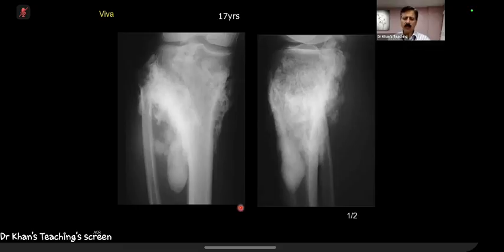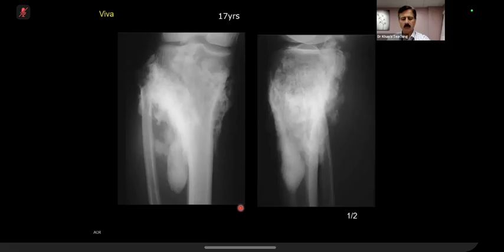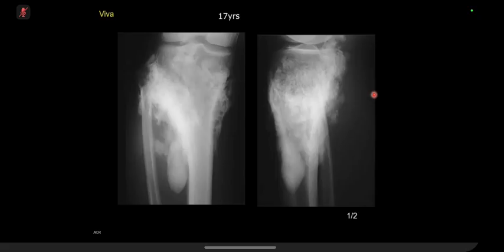Okay, so you described it. Some debate came to your mind as far as chondroid matrix versus osseous matrix. Can you revisit that? What were you considering? Well, just in parts of the lesion. So, for example, on the frontal radiograph, the inferomedial aspect, the calcification appears somewhat septated or ring and arc-like. So I just wasn't sure how best to classify this matrix, and if it classifies as one or the other, then we have to consider whether this is a malignancy of chondral origin.